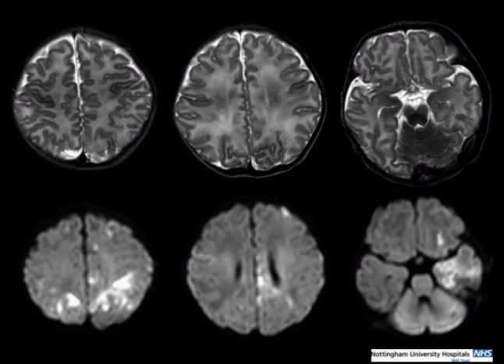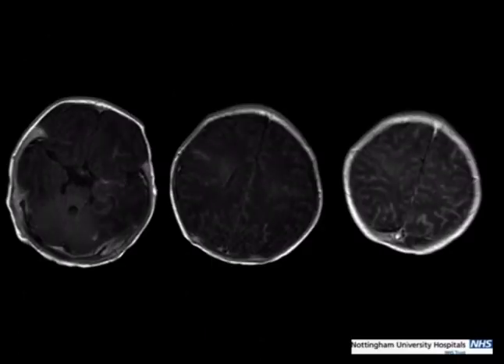myelination to help you. But when you add in the diffusion-weighted imaging, it's really abnormal. You can see these areas of diffusion restriction in the temporal lobe, in the posterior cingulum, but also all the way over the convexities here. Bit difficult to know what's going on. It's asymmetric. There isn't really any cardiovascular instability to help you to say infarction or ischemia.